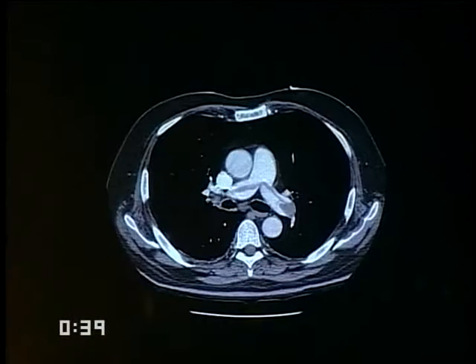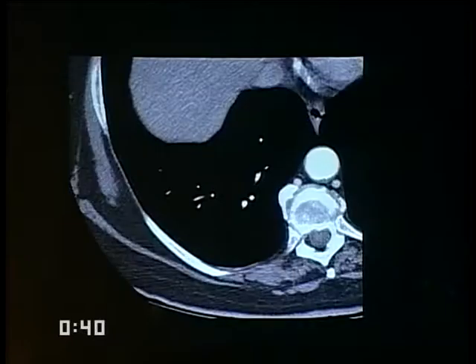Let's look a little bit at the findings and how they appear on CT scans. Classical saddle embolus, seen at the level of the pulmonary artery. Of course, this is now a relatively common finding that we do so many CTs for pulmonary embolism. We find this surprisingly commonly, occlusion of the descending pulmonary artery here. This is not difficult to diagnose, and indeed it could be done with certainly 5 millimeter or more collimation, and we do pick up these large emboli incidentally on many of our CT scans, particularly in oncology patients.